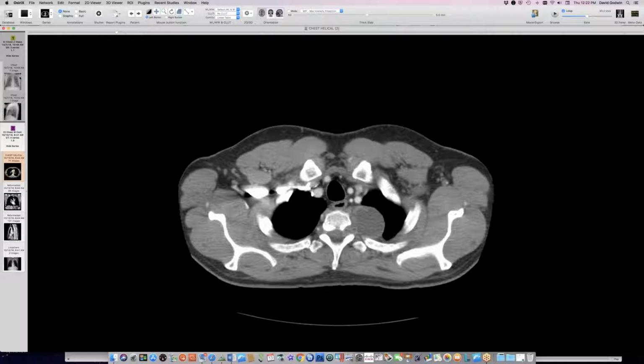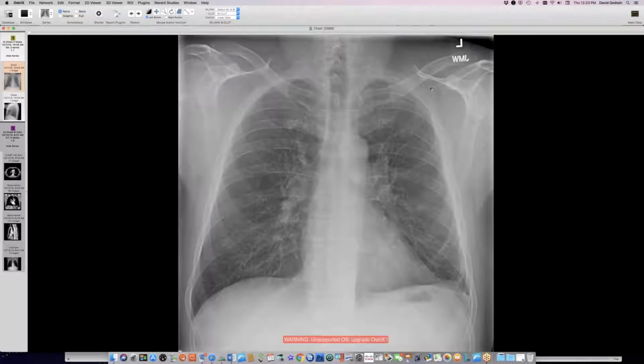They did a combined neurosurgical unroofing of the posterior aspect of the spine, I think a hemilaminectomy or something like that, combined with a thoracic surgical procedure to get rid of this thing. And after all that manipulation, I was relieved to see that there's nothing left in the lung apex, and there's been no bad effect, say, on the diaphragm or elsewhere. So a very clean resection of a schwannoma. So I like these smooth apical lesions.